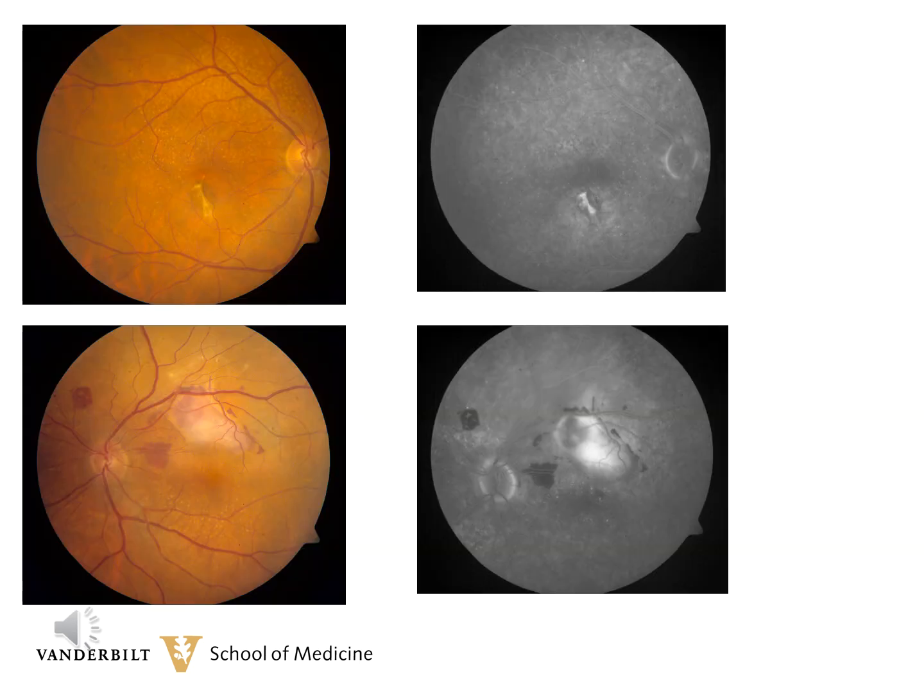Here is a very complex patient. This patient previously had an active choroidal neovascular membrane in the right eye, and it was treated with anti-VEGF, and that was several years ago. At this time, he has a yellowish lesion in the inferior right macula, and you can see on the fluorescein angiogram that this is hyperfluorescent. It is not leaking, but the vessels are staining the fibrotic tissue. So this patient had a choroidal neovascular membrane, treated very well, and he responded very well to the anti-VEGF treatment.